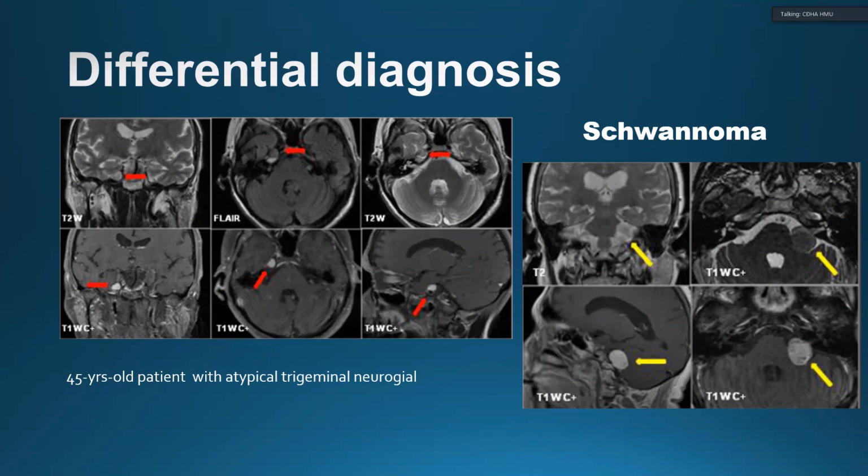The fusion is very simple when you do it on 3D. You can ask the technician to do the fusion for you, and then he sends it to the PACS, or you can do it yourself at the workstation. And it would be better if you do it at the workstation. You can have a vision on 3D.